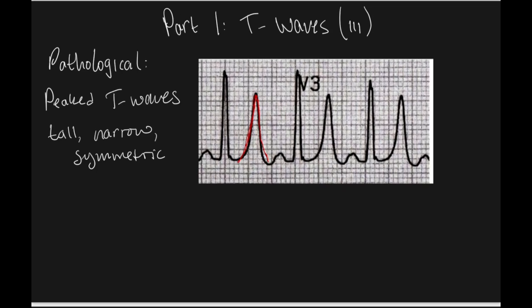I was always taught that they look like T waves that you would not want to sit on. And if we go to the peak of the T wave and come down to the baseline, it's definitely greater than 10 millimeters, which is our upper max for the T waves. A keen eye would point out the J wave.